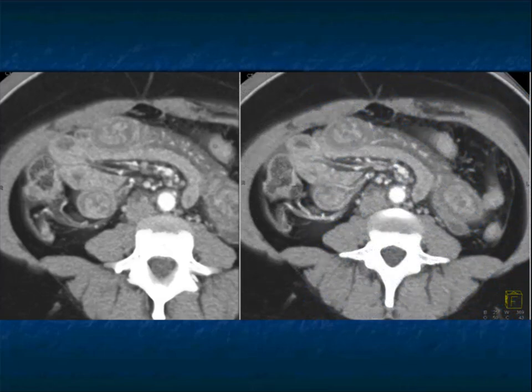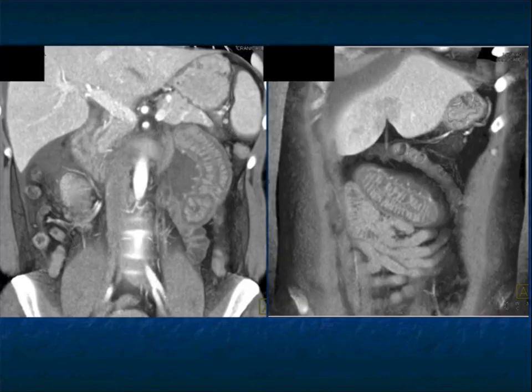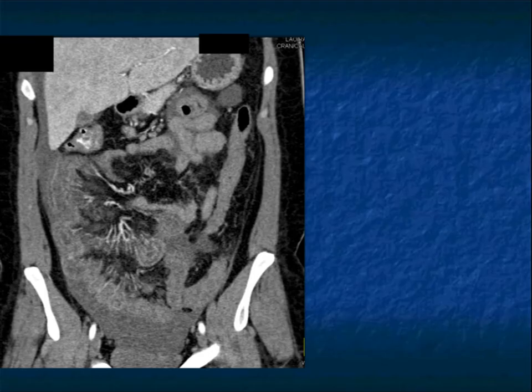You're thinking, is this an acute abdomen? That's how the presentation was. But does this patient need surgery? You're looking at really extensive disease, bowel, ascites. I'm thinking about something. Could the patient have embolic phenomena? I look, and the vessels look good. What has given me this marked edema?